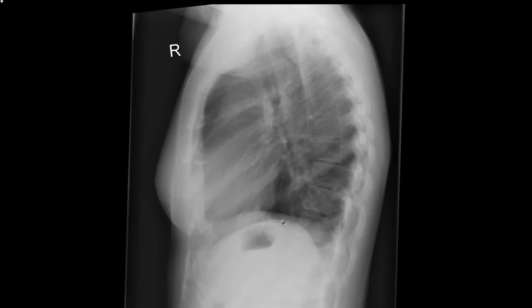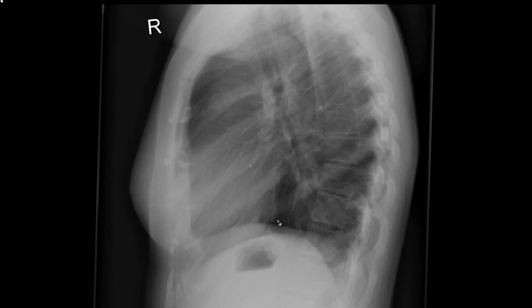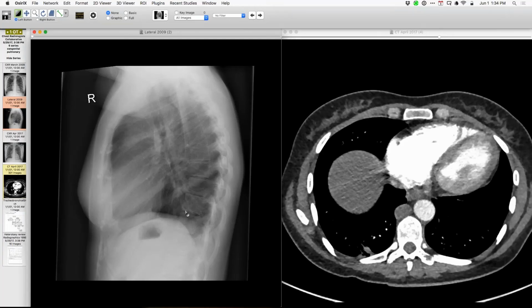And the reason it's there is the suprahepatic cava is indeed present and plugging into the right atrium. You're breaking up sometimes. The usual convex anterior interface of IVC there. Right. Can you folks still hear me? Do I have an internet connection problem, or maybe David? Howard, I think it's yours, and it's very mild.